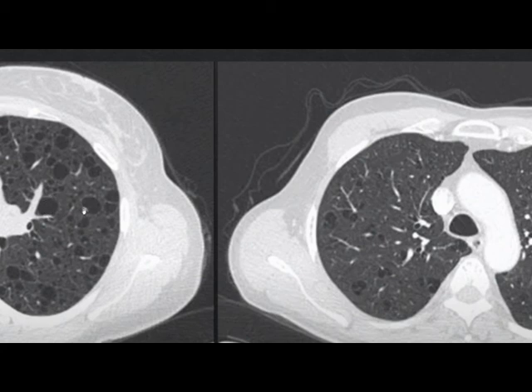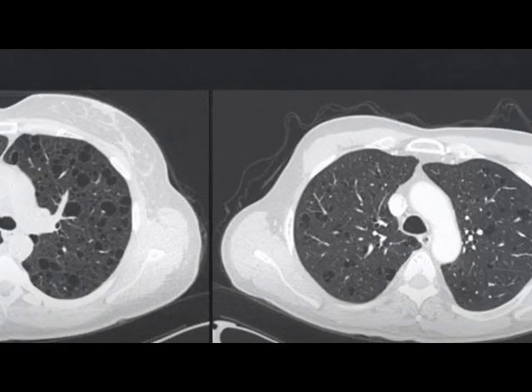The peripheral dots are simply pulmonary vascularity. This is a smoker patient with centrilobular emphysema. The centrilobular emphysema usually has no wall and contains what we call the centrilobular structure, the central dots. So be careful to differentiate those two pathologies.